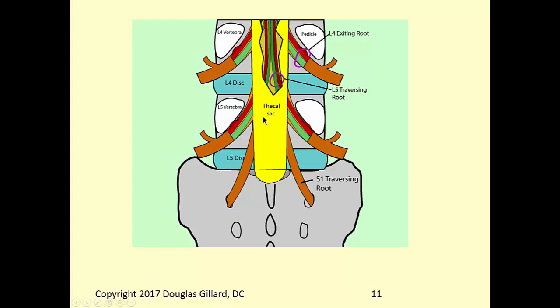The only difference is, like that picture I just showed you, look at this weird S1 root. L5 comes out behind, between the pedicles, like normal. S1 comes out right below it. So you've got a double budding behind the vertebral body of L5. Terrible to get a sequestered fragment in here. It can cause horrible pain. It can wreck both of these nerve roots.